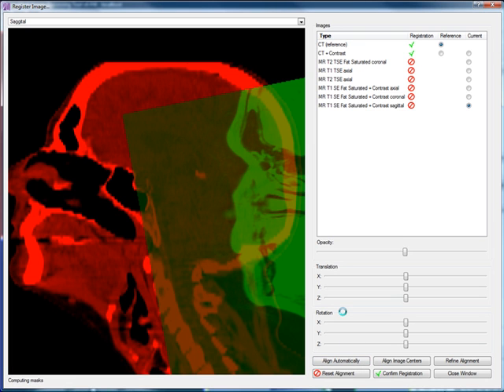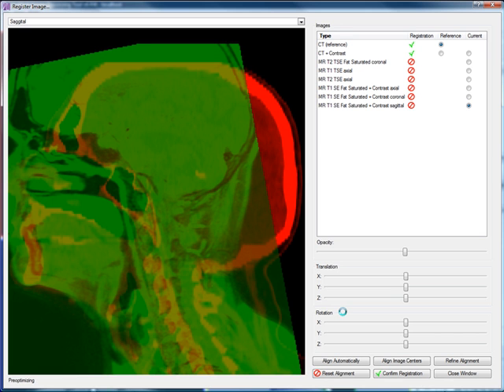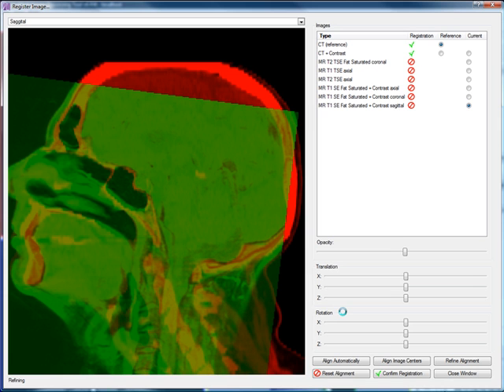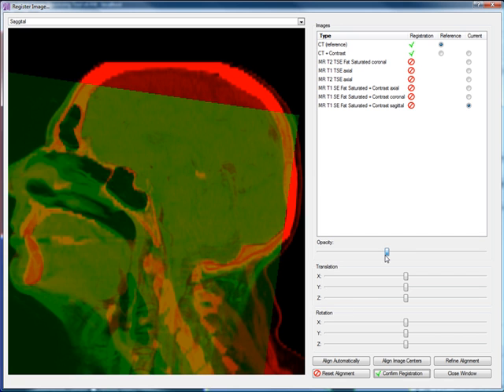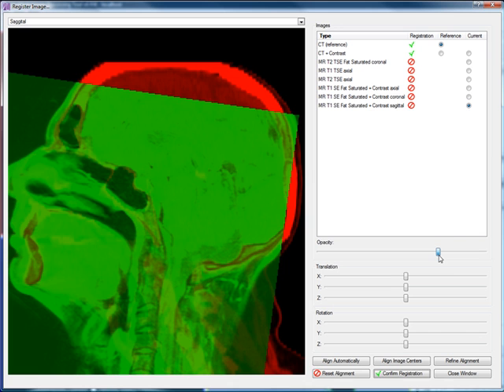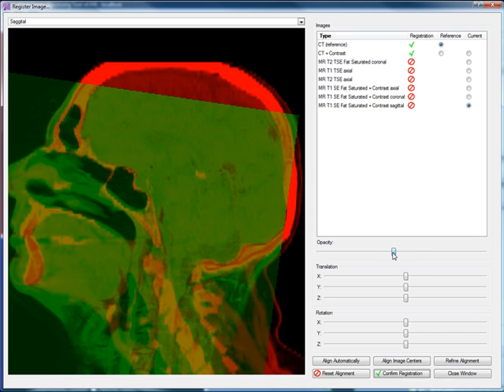This is done by detecting the chin in both images, resulting in an initial alignment. This alignment is then refined by maximizing mutual information, the state-of-the-art technique for multimodal image registration. As you can see, the head is now well aligned and features can be extracted jointly from both modalities. However, due to the different positions of the spine, the alignment in the neck area remains unsatisfactory. To address this issue, we are currently exploring and developing innovative, non-rigid registration methods.